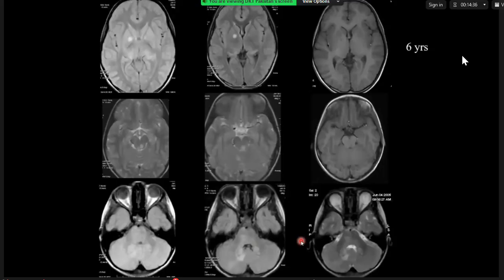In the context of neurofibromatosis, I would be concerned that these represent focal areas of signal intensity, otherwise known as UBOs, unidentified bright objects, which I think are hamartomatous lesions. But I would like to assess the rest of the neural axis for features of phakomatosis.